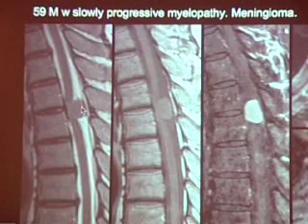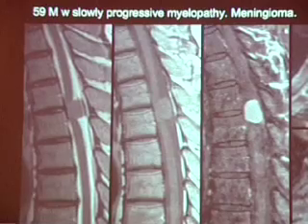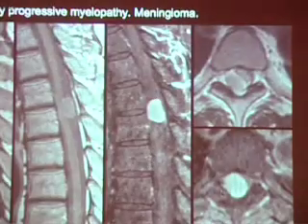It's intermediate on T1 and on T2. It enhances intensely and homogeneously post-GAD. Here you can see how it's really severely squishing the upper thoracic cord. And this patient has a meningioma.